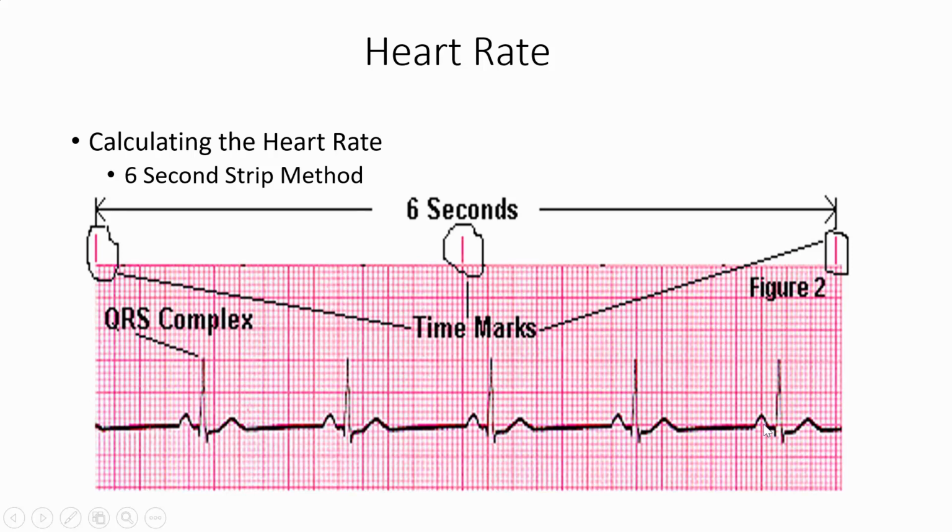Now, I know it seems very tedious, but to begin with, until you get really good at recognizing strips, that's what's going to help you build your confidence. That's what's going to make sure you're getting it right. So I do strongly urge you to use that 5-step method until you gain confidence in your skills and you know your rhythms.